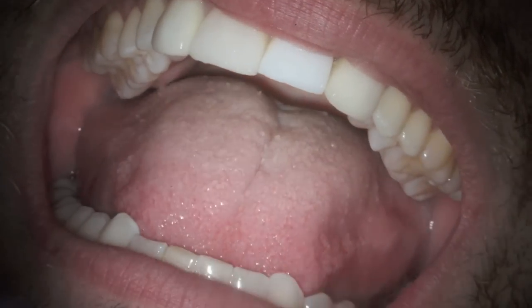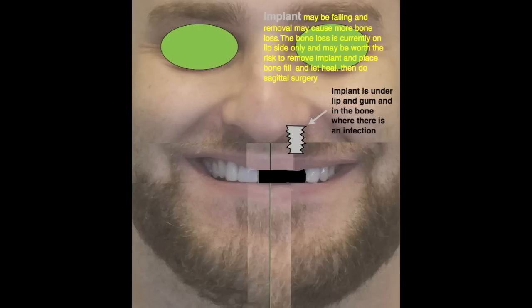So here's the evaluation. We're really trying to go from here where the palate is constricted. We'd like to open it up. It would look something like this. The patient would have to go immediately after surgery like that, but he does have that implant that's in the way, which probably will be replaced.